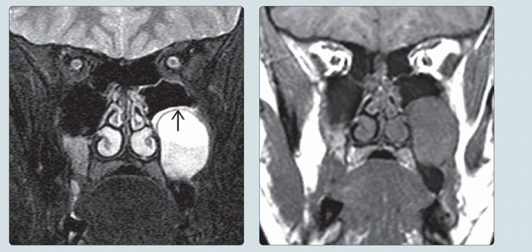Distinguishing a sinus mucus retention cyst from an alveolar ridge or dental cyst is best done on coronal images. Right is the coronal T1 weighted MRI, and it shows a T1 hypointense cystic mass. The floor of the sinus is less well characterized than on the coronal T2 image.